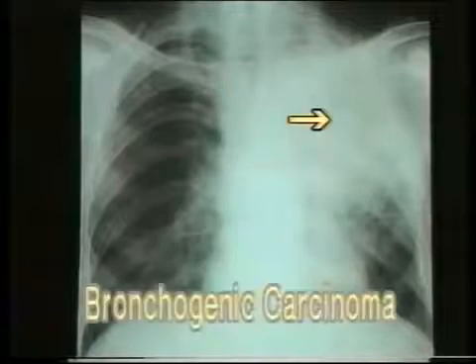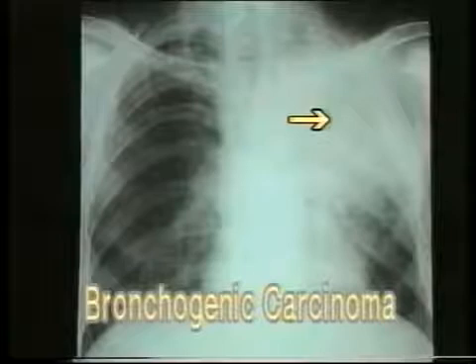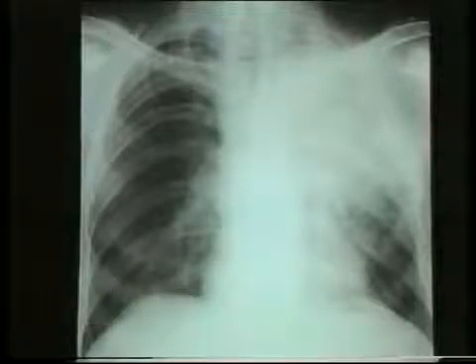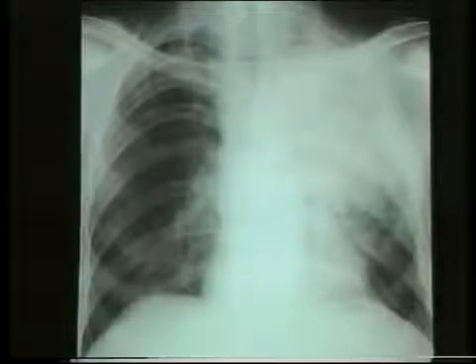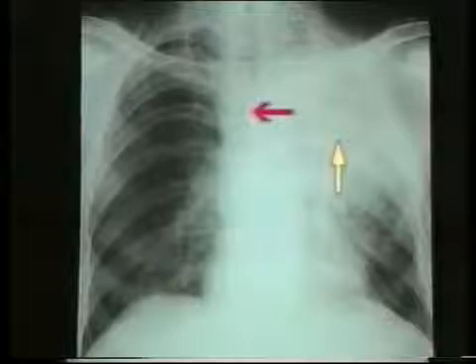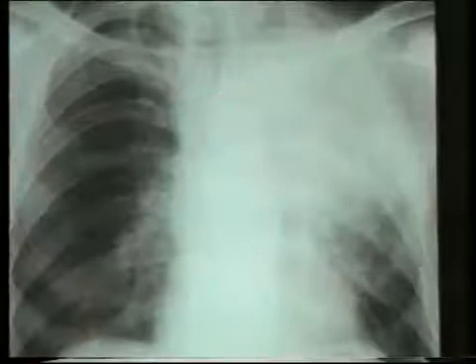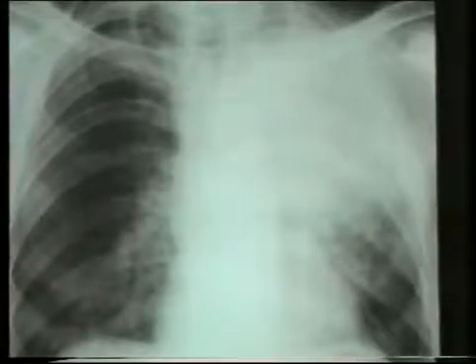This is another X-ray showing a more advanced stage of the malignancy. Note the dense homogeneous opacity of the left upper lobe. In contrast with a consolidation or pneumonia, the left diaphragm is raised. It's higher than the right diaphragm, indicating a collapse of the lung. At the same time, the red arrow shows the trachea pushed to the opposite side, probably by the main mass or by enlarged lymph nodes, which will not be seen in consolidation or collapse. In the close-up view, note the dense homogeneous nature of the shadow and how it spreads into the neighboring lung tissue.